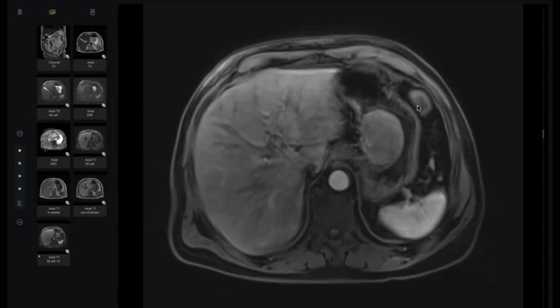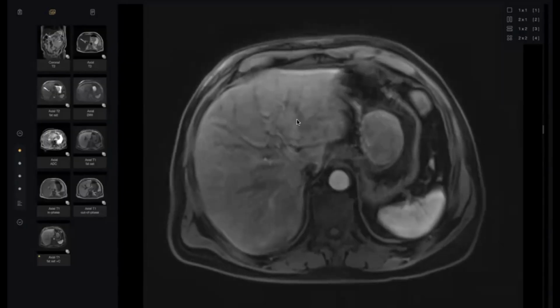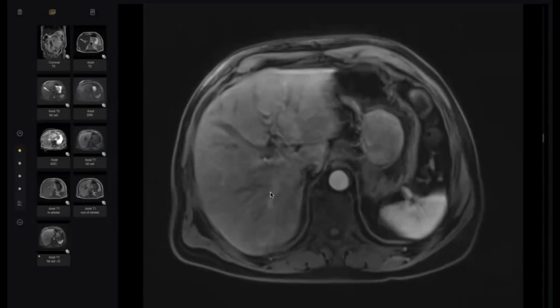To be sure, leave the mouse. We must compare with the pre-contrast. This is very important, by the way. Where is the pre-contrast here? No pre-contrast. Okay, and second, look here. It looks similar to the enhancement here of the liver. Yes, I think it takes some enhancement.